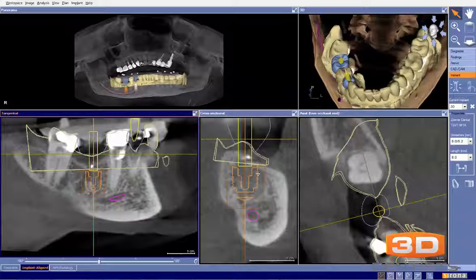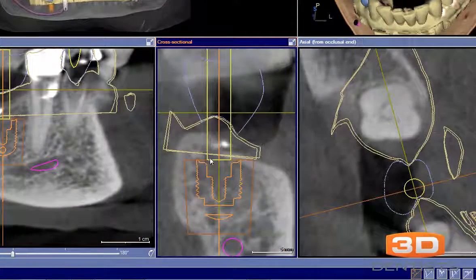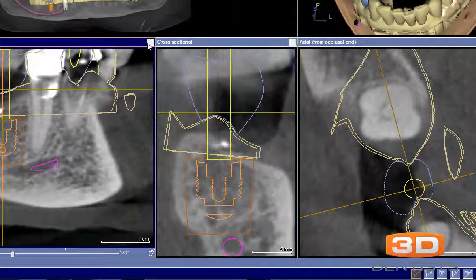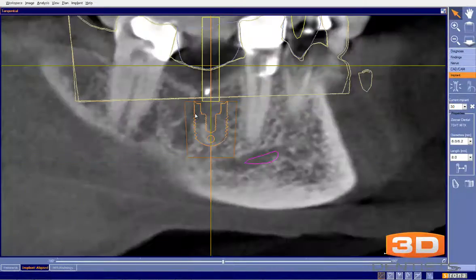Now when we go to site number 30, my concern with site number 30 is I don't like personally to place these implants this deep. I know why this was done, to avoid having to graft this area where we have some bone loss, but the negative in placing the implant this deep is going to be what happens to this bone right here and how that affects the adjacent teeth, or in this case the adjacent tooth is going to be lost, but still the posterior tooth.